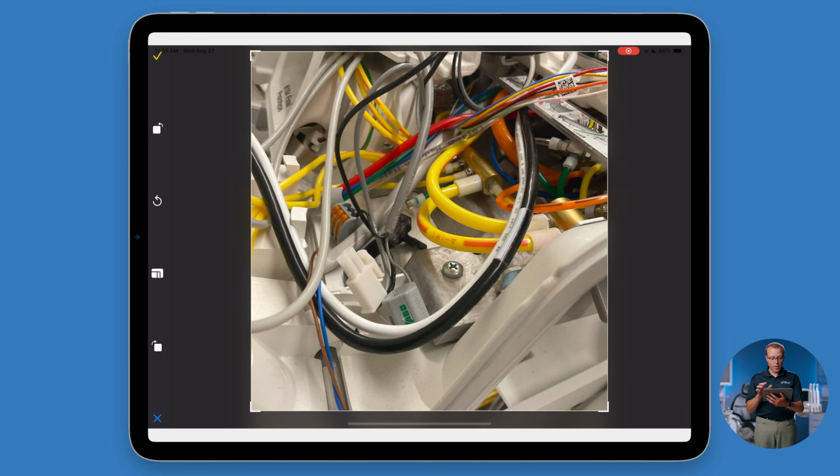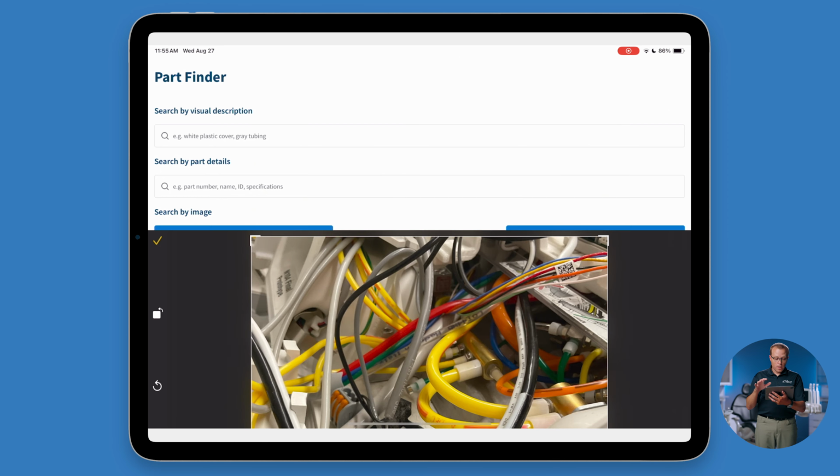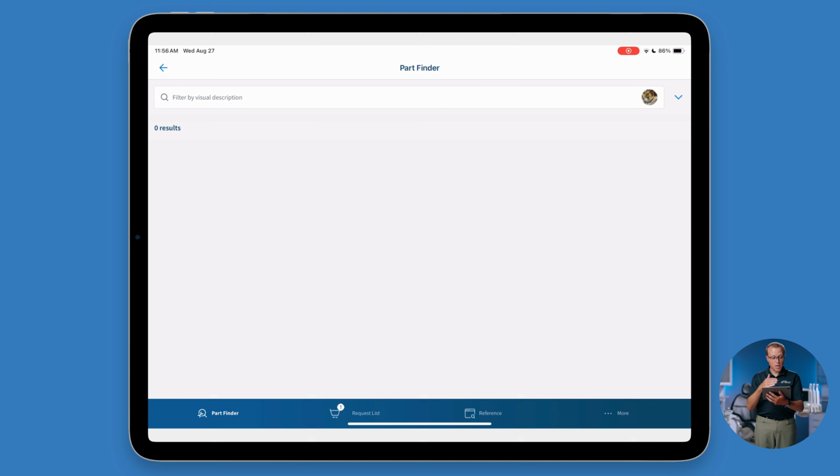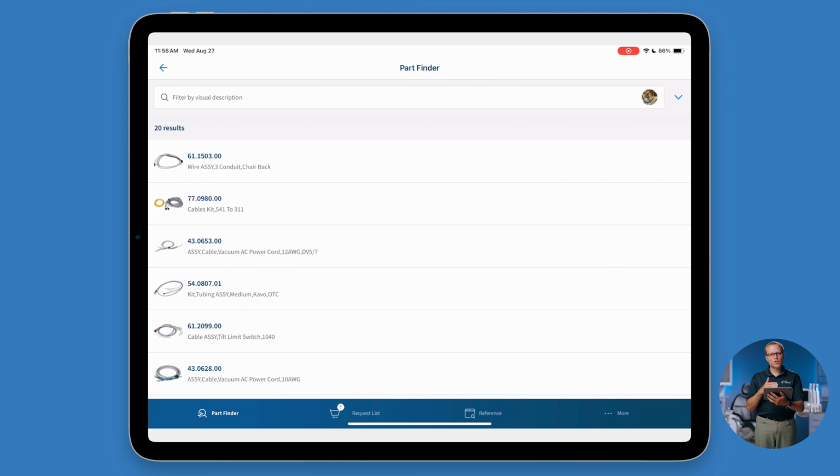And you can see here, there is a lot going on. There are connectors and tubings and screws. And so when it first comes back with its list of suggestions, it's not what we would expect. We're not there yet. But what I can also do is take that list that's already been filtered. Again, I've submitted a photo and it's filtered it one round.